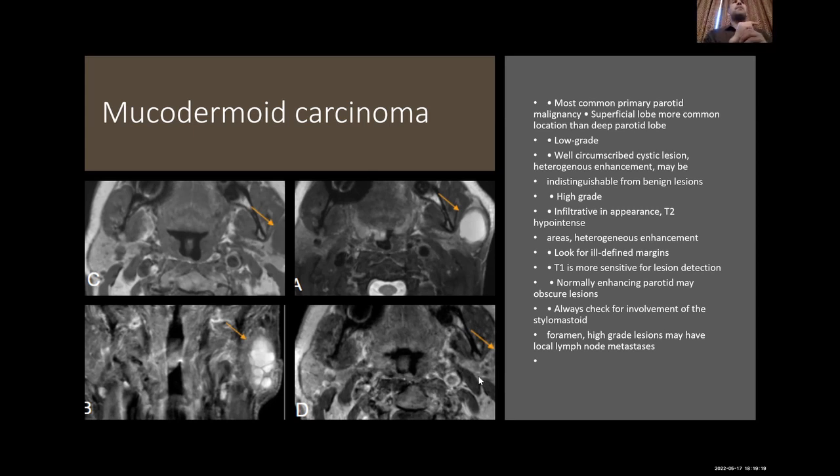What is the easiest sign to rule out perineural spread? The anatomy. Pterygopalatine fossa. Check here in this region, and this region, and the muscles. If you find muscle edema, unilateral muscle edema with a parotid lesion, it is perineural spread. Okay, this is perineural spread.